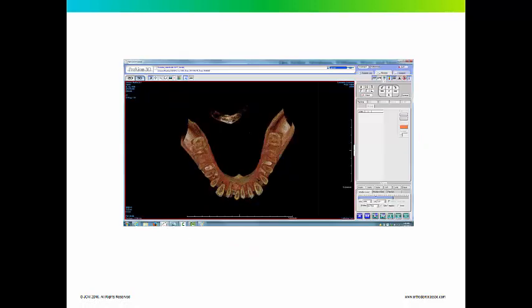This is an axial view of a patient with orthodontic dehiscence pattern. This was a transfer patient who came in to our practice. She had been treated by an orthodontist who used an expansion technique to avoid extraction of teeth. You can see from the shape of the pulp chambers, and this is a 3D reconstruction, but a slice taken into the roots. These are the roots. There are no clinical crowns here. And you can see how much dehiscence has occurred for this patient.